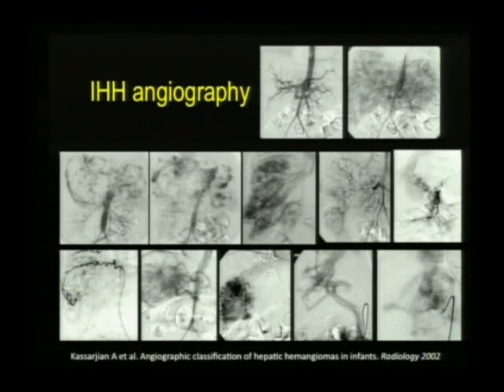And there are a variety of patterns that you can see, from areas of hypervascularity, puddling within the liver, hypervascular nodules and drainage into prominent hepatic veins, hypervascularized nodules without drainage, arteriovenous connections, arterial supplies from areas we may not expect sometimes, like intercostal arteries. These lesions, the hepatic hemangiomas, can recruit arterial supplies. They don't just get an arterial supply from the common hepatic artery, they can come from the internal mammary, the phrenics, the renals, intercostal.